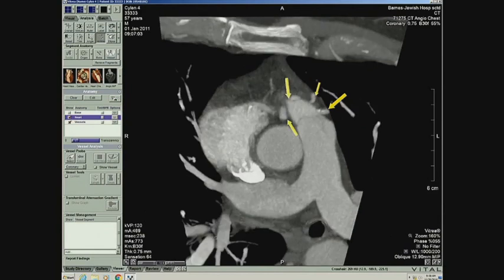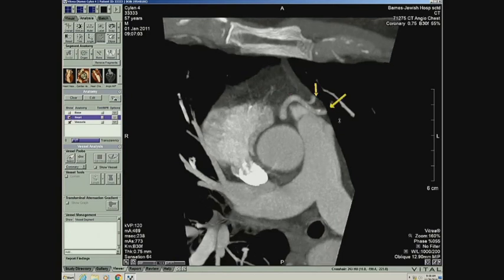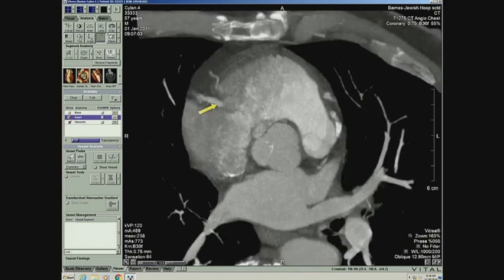So if I could thicken that up, maybe I can show the course in one image. It's taking a prepulmonic course. And then right here at this level is where it's bifurcating. This pink arrow here becomes, let me make it pink. Okay, it's not doing it. This pink arrow here, okay, the yellow arrow here, it becomes the LAD. And this other pink arrow here becomes the circumflex.